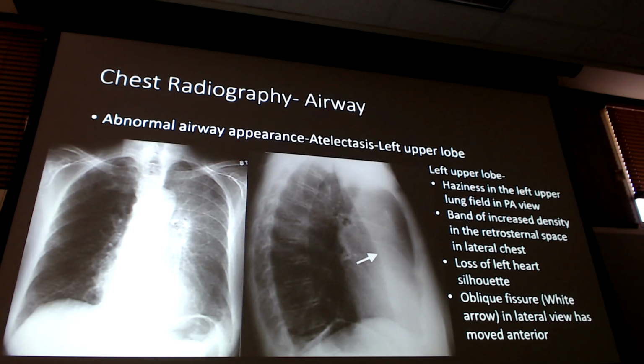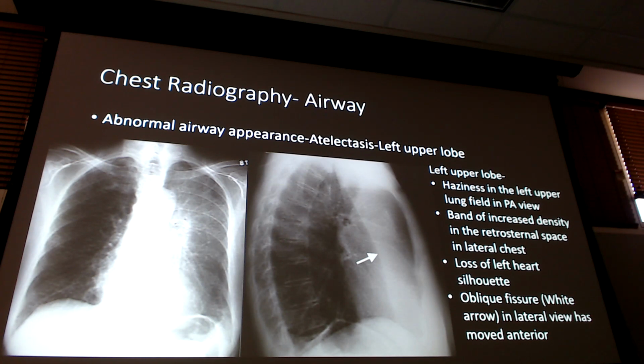Okay. Let's look at some more. This is what I was talking about in regard to how the other lung will take up some of that space. Okay? The other lung will take up some of that space. So take a look at these two images. This is not a technique thing.